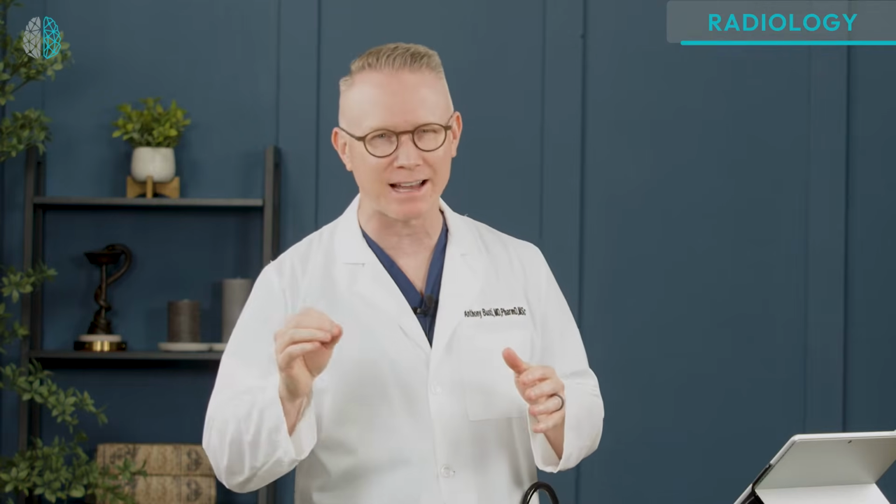I'm going to show you a simple way to tell AP versus PA in seconds so that you don't get fooled by things like thinking the patient has a bigger heart than normal on a typical portable chest x-ray. We'll also walk you through the chest x-ray interpretation and how to read the chest x-ray and apply it clinically.